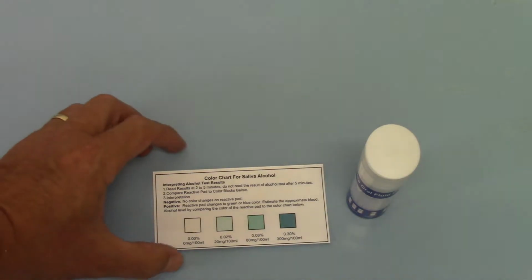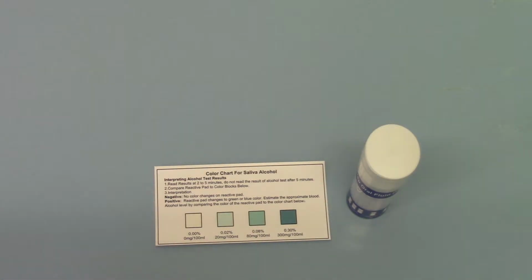Now, the vital thing to talk to you about is the need, if you're doing this in a workplace setting or healthcare setting, to confirm all positive indicators to identify the exact drug that is giving you that positive near patient screen. And that would need moving to a back to lab sample collection and test kit pack that would give you a GCMS result showing you the absolute level and drug that's giving you the positive point of care test.